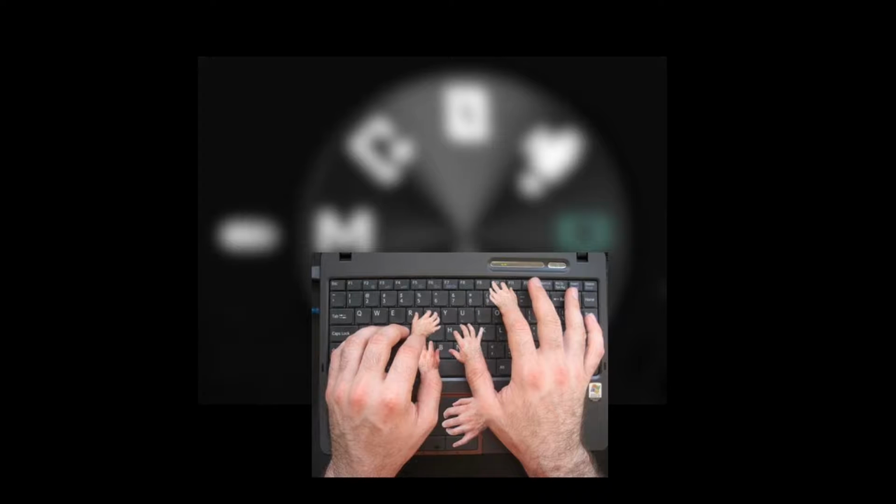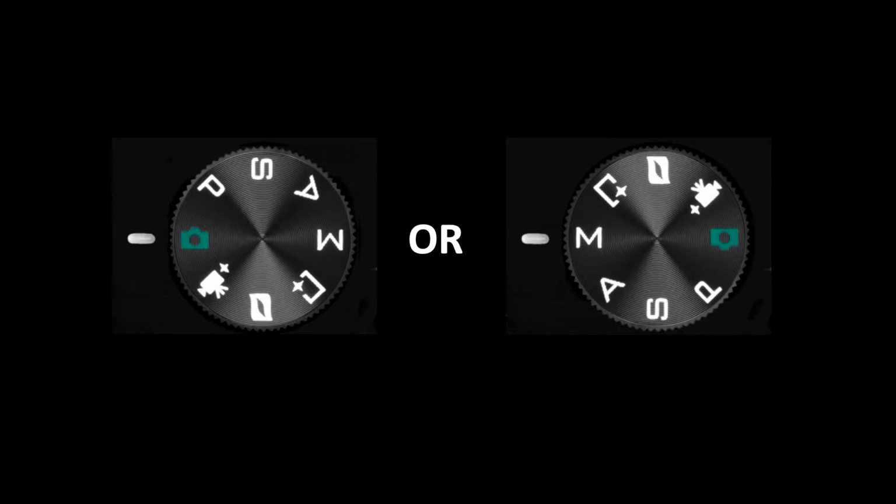If you've ever operated a mannequin, you've had this feeling before, not enough hands and fingers to go around. Using LEAP Simplicity will help limit that feeling. The decision has to be made for what's best for you and your center. How much time do you have to program, and how detailed does your programming need to be?